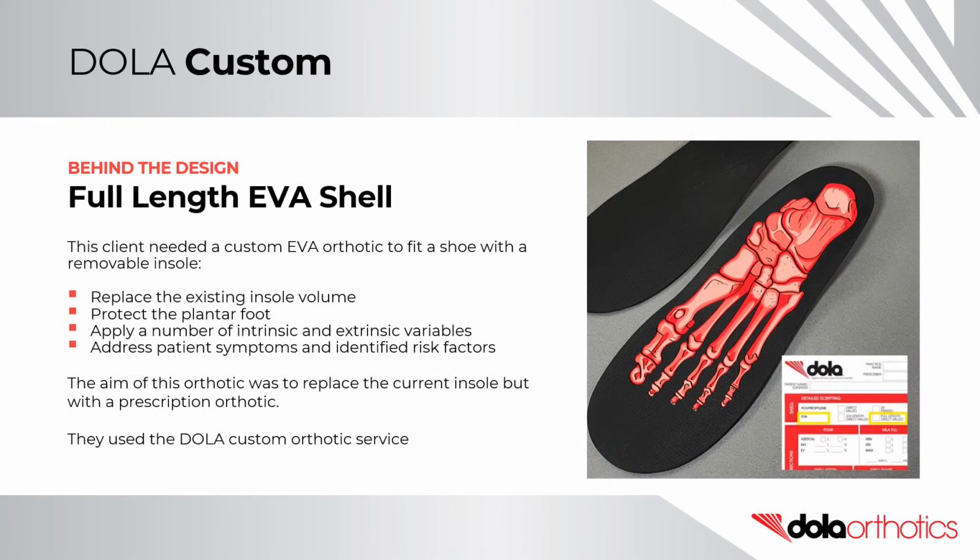Behind the design, full-length EVA shell. This client needed a custom EVA orthotic to fit a shoe with a removable insole. They needed to replace the existing insole volume and protect the plantar foot, while also applying a number of intrinsic and extrinsic variables to address the patient's symptoms and identified risk factors. The aim of this orthotic was to replace the current insole, but with a prescription orthotic.